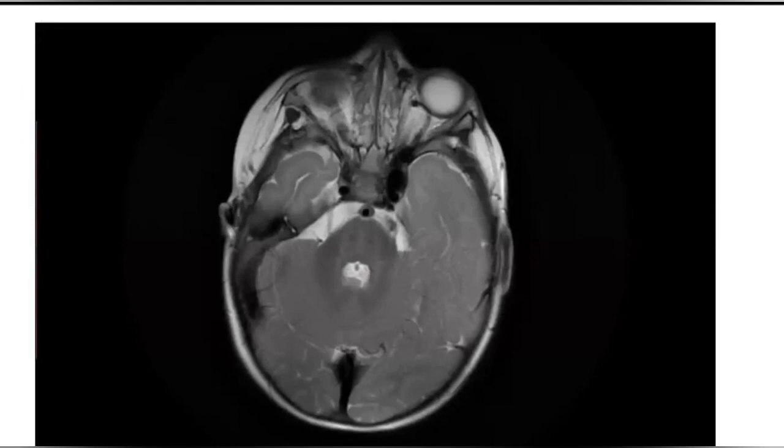Kid, and he had trauma. So this is your first film. Okay, this is provided MR axial images, T2 image, showing there is a hypointense area, hypointense signal involving the right temporal region.